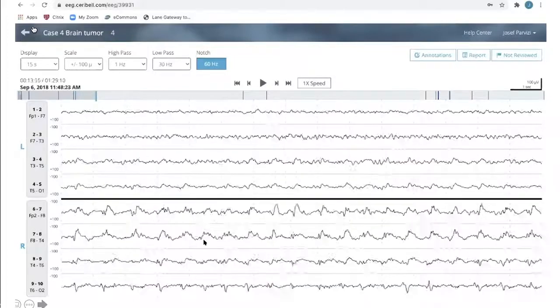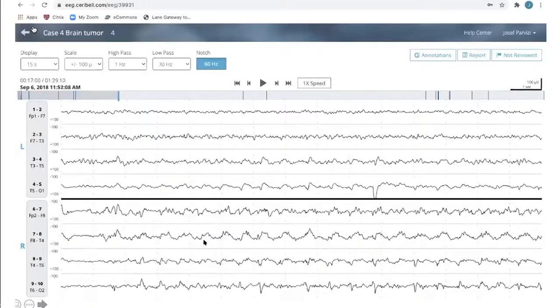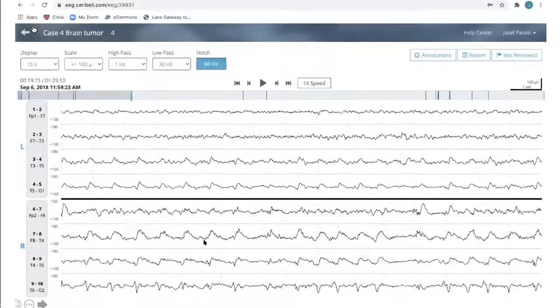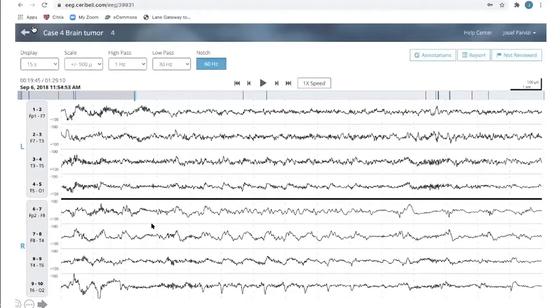Do you want to comment on what happens to EEG after the treatment is given? I think around 19 minutes the treatment is in, and let's see how the EEG goes from seizure to non-seizure. So on this page, I'm seeing on the right side 4, 5 clear epileptiform discharges, but between those discharges, it's just a suppressed background. The suppression can be because of the aftermath of the seizure, and the suppression isn't necessarily something ominous.